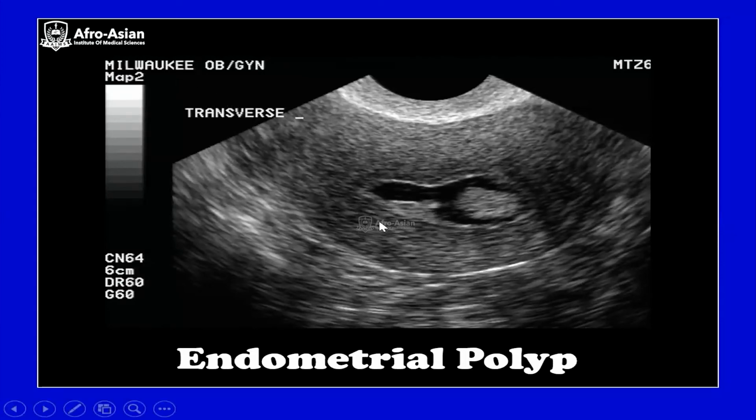A pedunculated fibroid will not have a thin single vessel stalk or peduncle. It will have a thick peduncle which will be attaching the fibroid with the endometrial wall. It will be having a thicker area as compared to the stalk of the polyp.